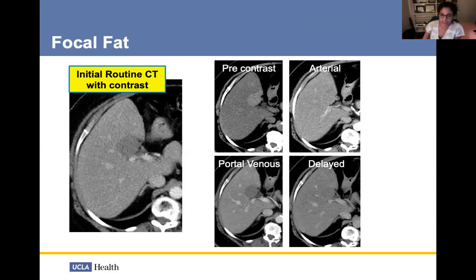Like I don't see this as focal fat. I see it as a fatty spared nodule, probably, and in the setting of chronic liver disease, like a regenerative nodule. I think that would be an even better explanation, because on that pre-contrast, the liver looks fatty. Yes, on the pre-contrast, the liver does look fatty. Which I think is a good point. The liver does a lot of regeneration in these patients with chronic liver disease, and so those nodules might end up sparing fat or have a different kind of composition.